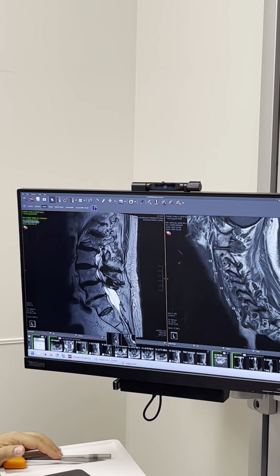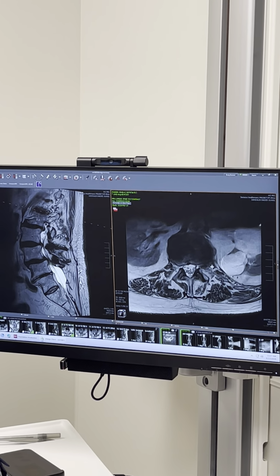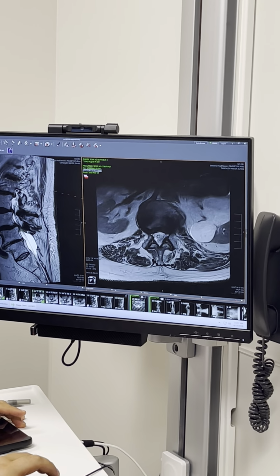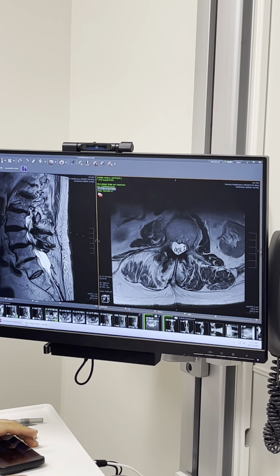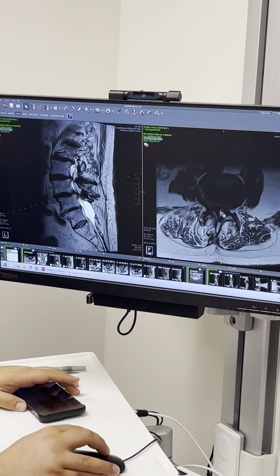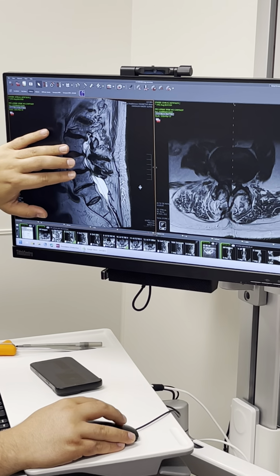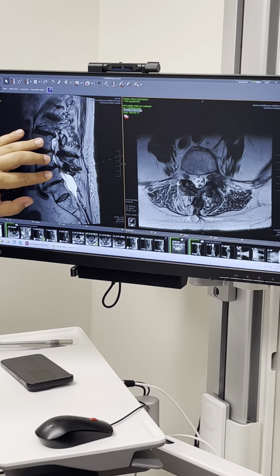Now, the reality of this is, this is another type of picture. That's if we were to cut you like that. I call it slice of bread style. Front, back, side. These are the nerves. That's looking from the top down. Nerves and white around them is spinal fluid. And as we go down, this is normal. Then as we get to these areas down here, you do have significant pressure on these nerves and more pressure here. We're going to call that, you have what's called transitional anatomy, but we're going to call that L3-4 and L4-5. That's the bottom of your spine, okay?